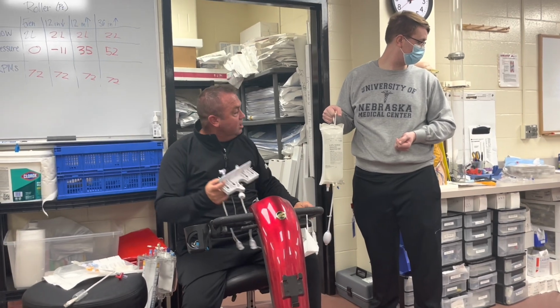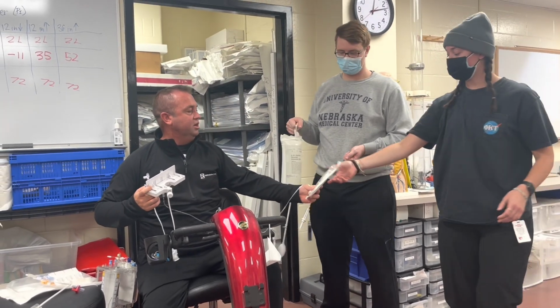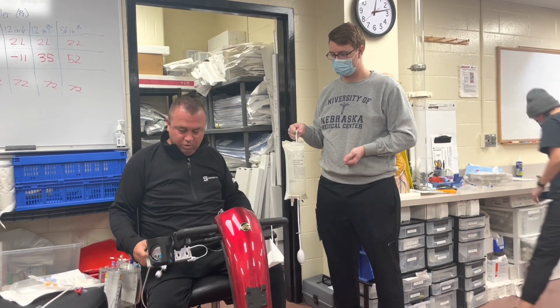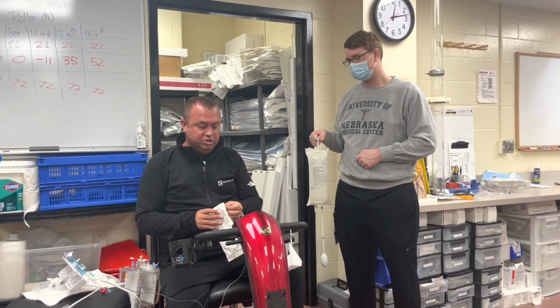You want one of the little yellow ones? Just any pressure tubing, perfect. Yeah, this should work perfectly fine. So we'll use this one.